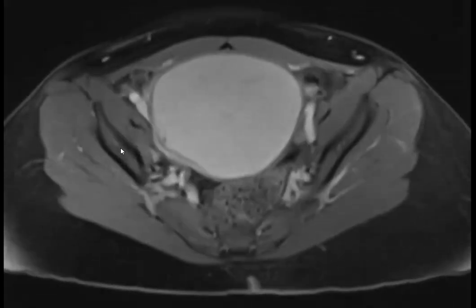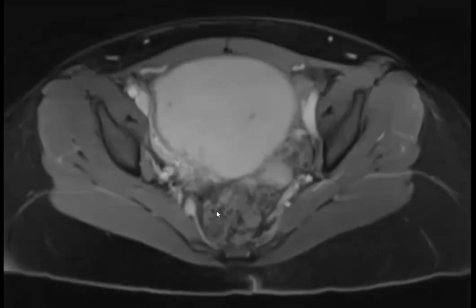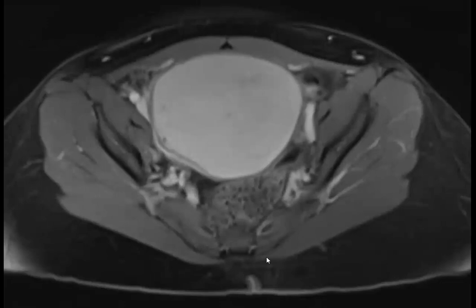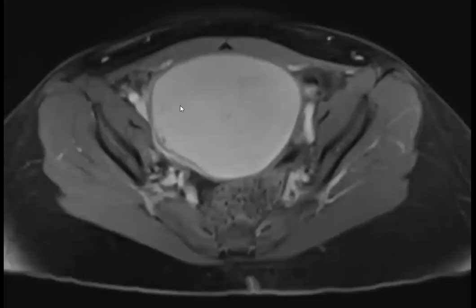Aarti, really cool case. Can I add one small thing on that ultrasound image? Yeah. There was a nice finding there. Okay, let me pull it back up. Sounds good.